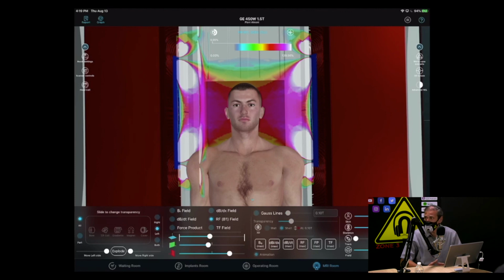To me, it seems that the pictures are worth 1,000 words. Oh, yeah. And being able to see that it's an extremely heterogeneous distribution of the energies that we're irradiating makes it easier for them to understand why, if I could just stick something between the white areas where it's so powerful of an exposure, maybe it won't cause a burn. And this is just an average-sized person. Who is more likely to get flush up in the middle of that white area? Morbidly obese, a football player.